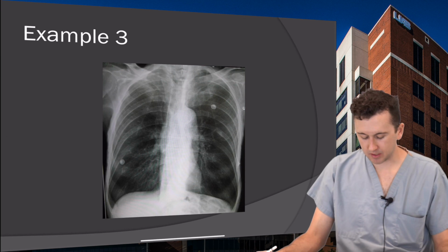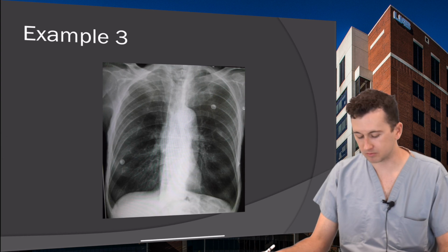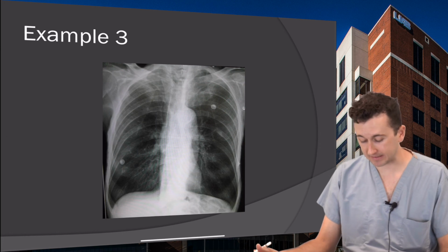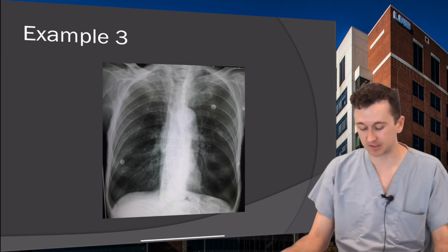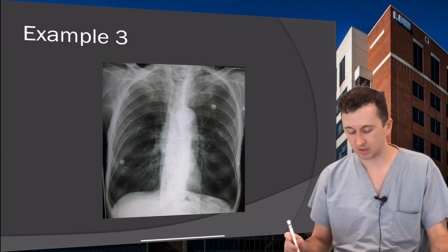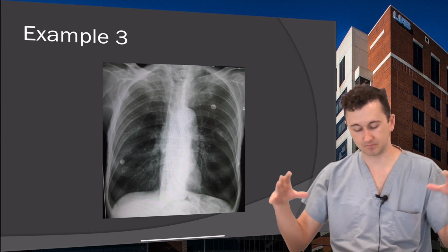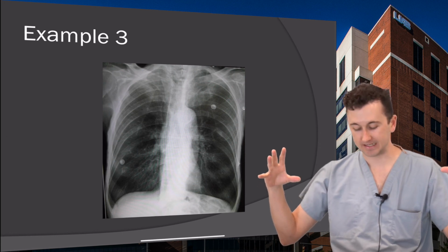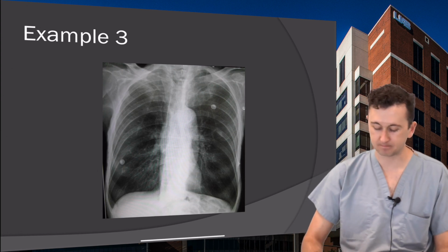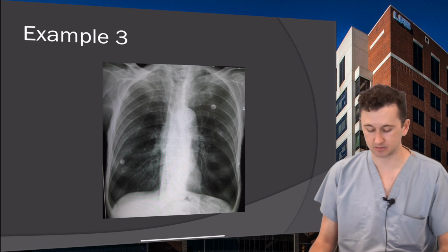So this patient, if this was a test vignette, it would be something like a 59-year-old gentleman with a 40-pack year history of smoking, comes in complaining of shortness of breath. This is a classic COPD patient. So remember, COPD is an obstructive lung disease, which means they have difficulty getting air out. And so they can get the air in just fine. They fill up these alveoli, and they can't get that air out. And so again, air is less dense, and so it gives you this broad, darker X-ray, just because there's so much air in these patients' lungs.